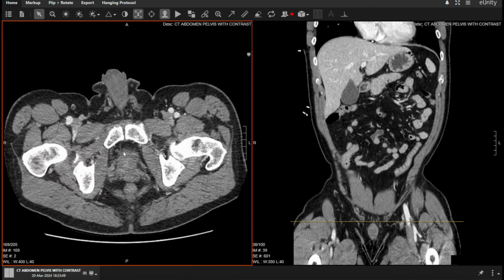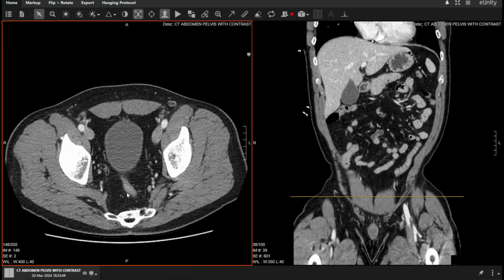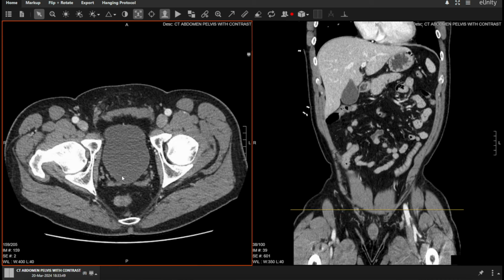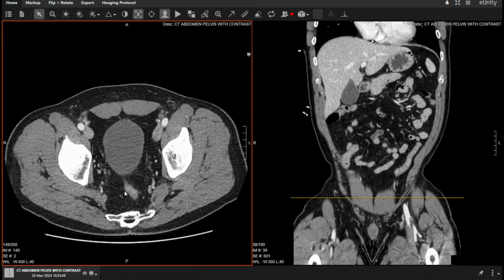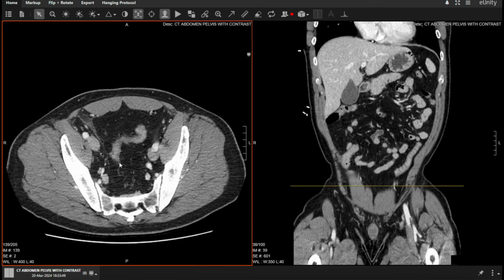So to do that, the easiest way is to start down here all the way at the anus/rectum, follow it up, and at the peritoneal reflection, which is right around this area, around 12 to 16 centimeters of rectum, the rectum becomes intra-abdominal and turns into the sigmoid colon. And you see the sigmoid here. This is the S shape for sigmoid.